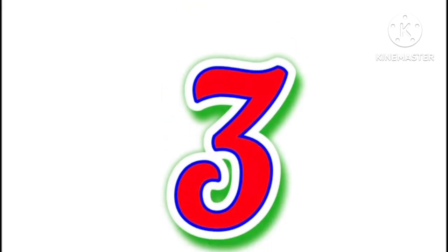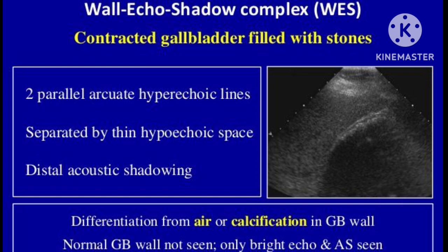Let's discuss wall echo shadow. Wall echo shadow, that is the WES pattern of shadowing, is seen in case of gallbladder filled with multiple stones, that is gallbladder with impacted stones inside. WES complex, that is WES complex, consists of two parallel hyperechoic lines which are separated by a thin hypoechoic space having a posterior acoustic shadow.